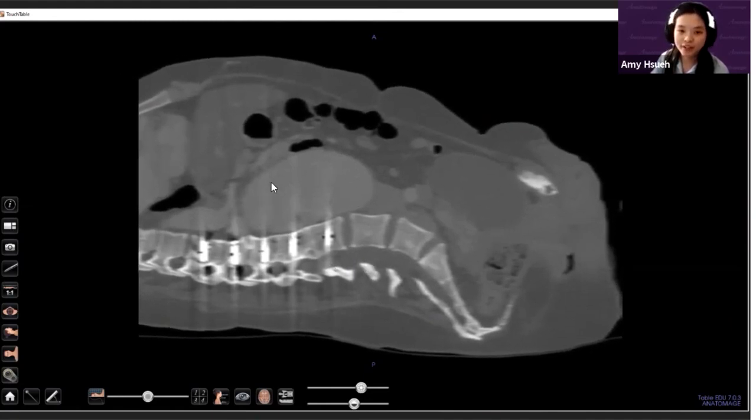So I think number one, you can definitely see evidence of that aortic aneurysm right there. You can adjust the brightness a little bit and tell your students to maybe annotate it or outline it, mark it out, and perhaps take a screenshot of it as evidence of their findings. So you say, okay, check number one, we found our aortic aneurysm.